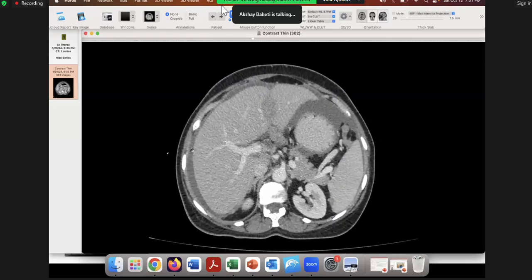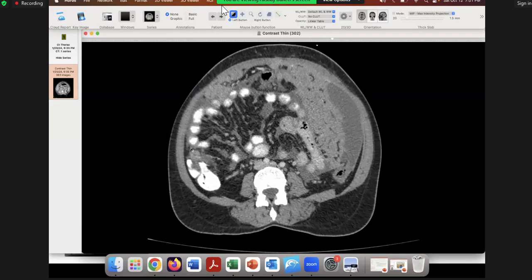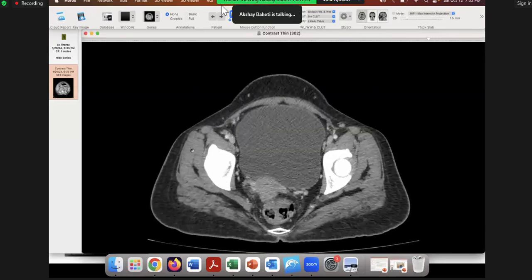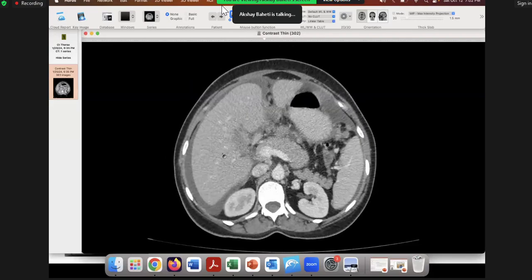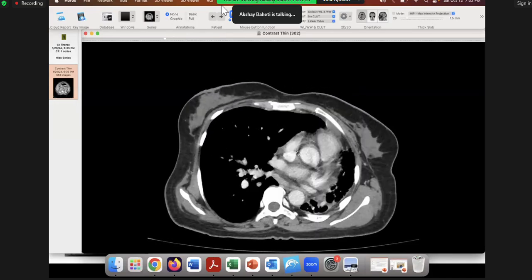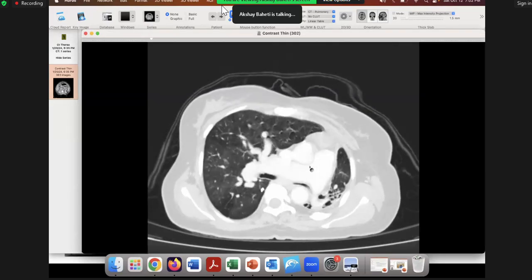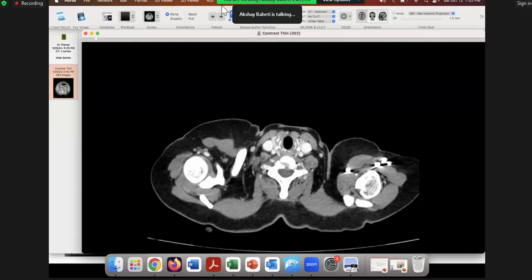Cancer. And I just thought that's one thing that everyone often reports, but what exactly do we report and what exactly do they want us to let them know is the question. So here's the first case, and why don't one of you just describe the findings and we can discuss it, okay? So ignore the fibrobronchiectatic changes and all of that. Yeah, so that's post-infectious, ignore that. Let's talk about ovarian cancer only, okay?